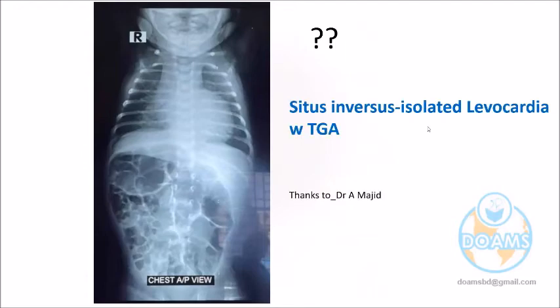Hernia. If bowels are in the chest, weird. But the picture shown here is situs inversus, isolated levocardia with transposition of great arteries. Do you think the situs inversus is there? Seems to be, but the heart shadow is here.